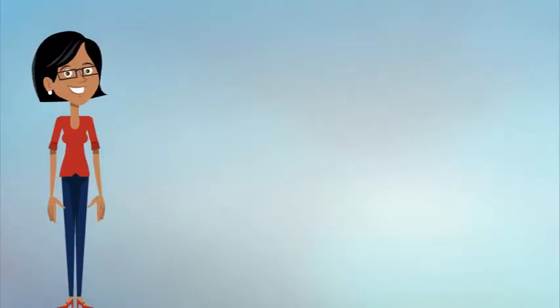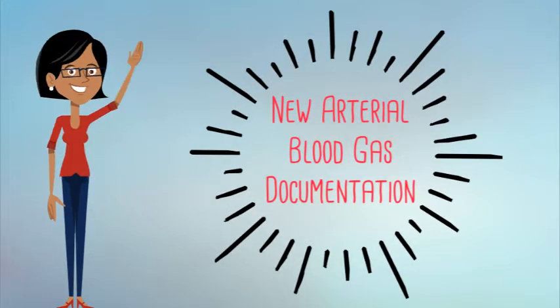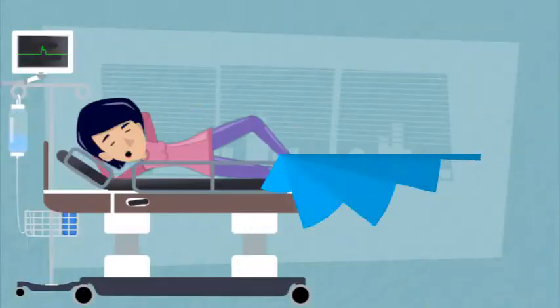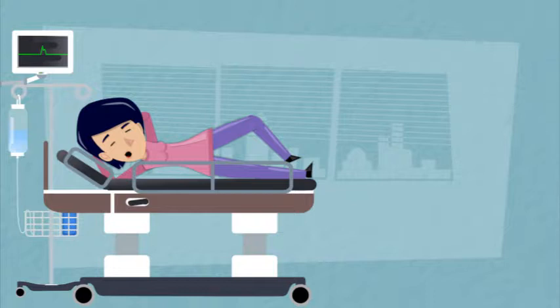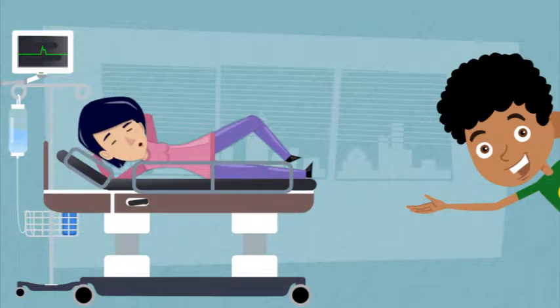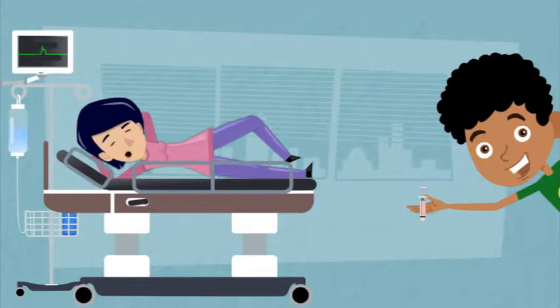I am excited to talk to you today about the new way that respiratory therapists and nurses will document arterial blood gas draws. Imagine this. You are taking care of a patient that is having acute dyspnea. You receive an order to draw an arterial blood gas. You are prompt at drawing the specimen, and now you need to send it for results. But what information does lab need before resulting in EPIC?